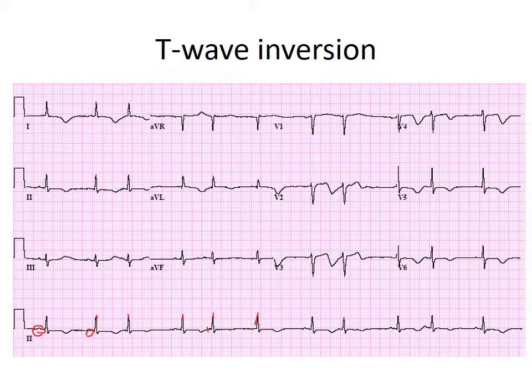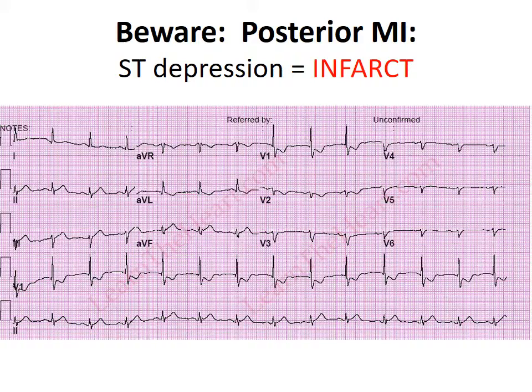So this is atrial fibrillation, but it also has T-wave inversion in leads V2, 3, 4, 5, and 6. So you have some ischemia going on along with atrial fibrillation. If we look at lead 2, 3, and AVF, just look, it's flipped, inverted T-waves in 2. AVF and lead 3 are upright. So no ischemia in contiguous leads in the inferior leads. All right, so atrial fibrillation and ischemia.